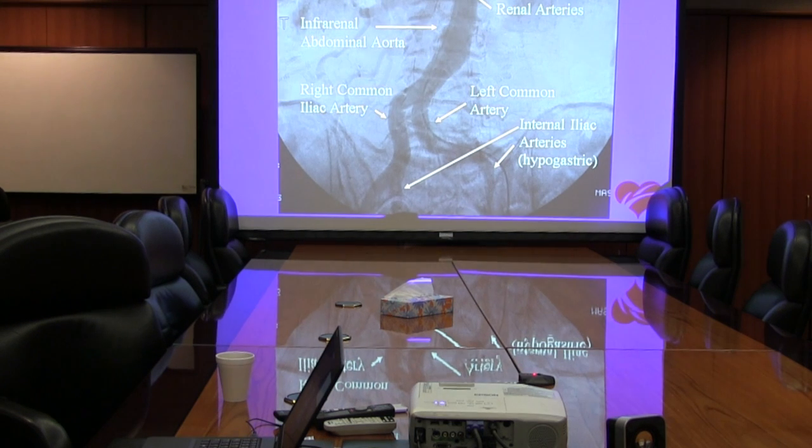So this was prepared for physicians who were coming to a PVD course, but it works. They're all angiographic pictures. This is looking at the abdominal aorta. You can see where the renal arteries are pointed out. The renal arteries are retroperitoneal structures, so although on the angiogram it looks like it's coming straight out from the aorta, if we were looking down at the aorta, they're really coming back towards the back, off at an angle. So to get proper images, we do contralateral views or angulated views.